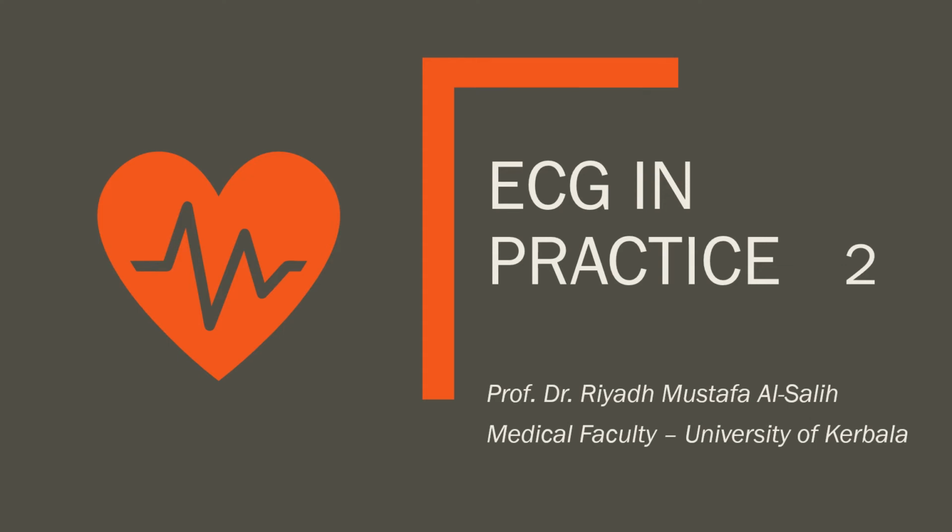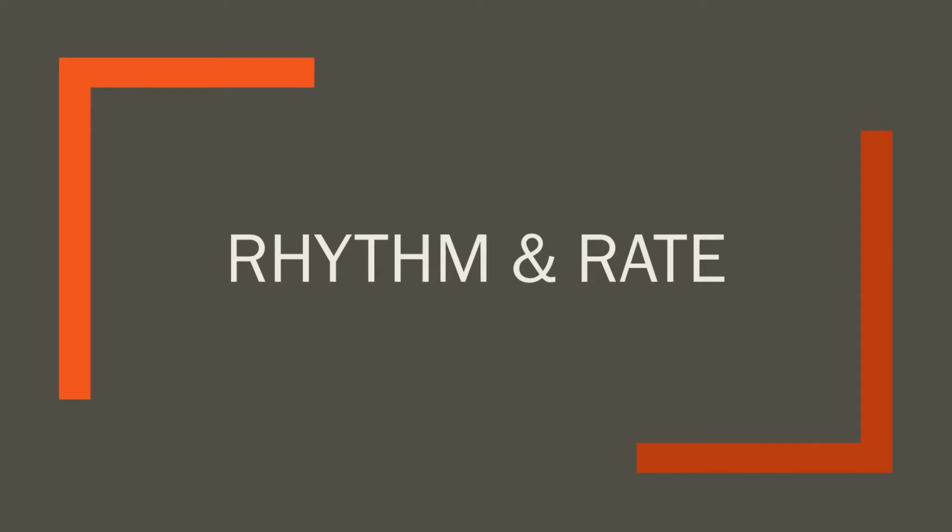Bismillah ar-Rahman ar-Rahim. This is the second part of the practical lecture ECG in practice. The objectives of this lecture will be how to read the rhythm and rate in the ECG and how you can interpret them.